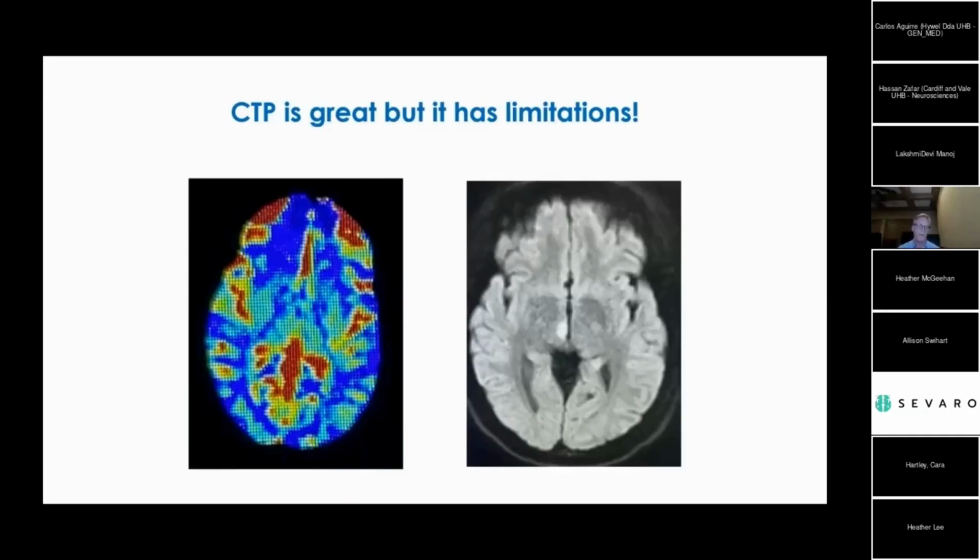I personally think you have to have 8 centimeters or better to be doing diagnostic imaging, but 4 centimeters of coverage has a sensitivity for stroke detection of 70%. 8 centimeters has a sensitivity of 80%. 12 centimeters has a sensitivity of 90%, and 16 centimeters, which is whole brain coverage, has a sensitivity of 95%. For reference, MRI has a sensitivity of 99 to 100%. So CTP is awesome, but there are limitations.